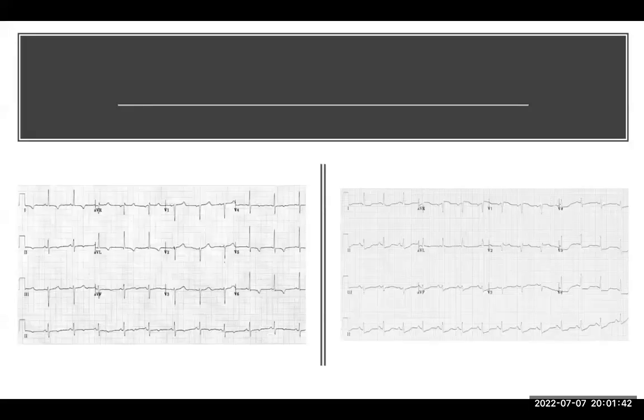That one you can comfortably actually use the word MI because it's infarcted. Q wave means that area is scarred, that muscle has died. And therefore, you can actually comfortably say lateral MI. You can actually comfortably say anterior MI. When you see Q waves, you can use the word MI. But unless you see Q wave or the troponin is elevated, you cannot use the letters MI.